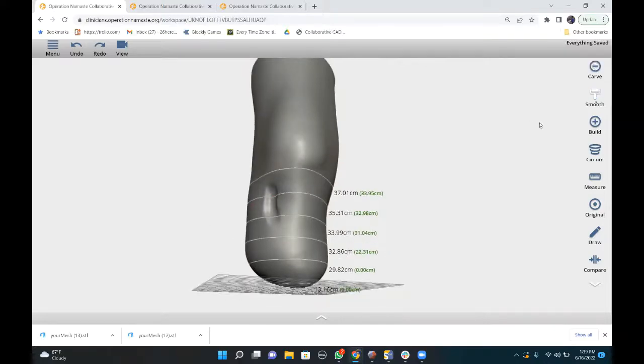And then because that's a little rough, you would go back over that and smooth. Now I'm currently doing this with a touchpad. You can obviously use a mouse for this, but the best thing is a touch screen. It works very well on a tablet, and it also works on a smartphone. On a smartphone the screen's a little small for it, but I personally prefer an iPad or a tablet for the way I do it.